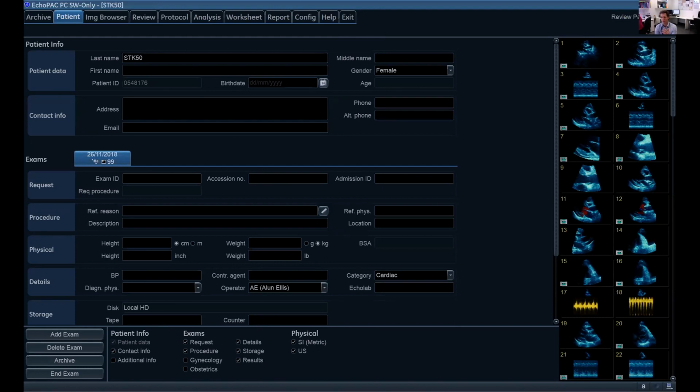So Danielle, you're at the top of the screen. Let's just talk about characterizations of pericardial tamponade. Why don't we start off with the 2D, and then we'll work down the list. Because if you're talking about how to diagnose tamponade, it's a pretty nice one that you can split up into 2D and Doppler analysis. So Danielle, go for it.